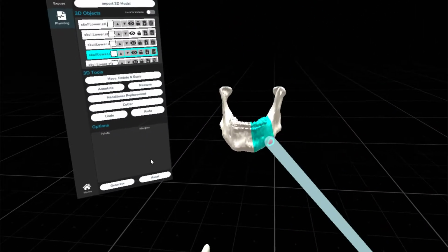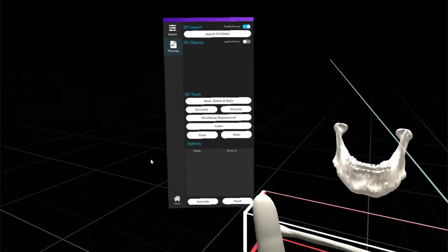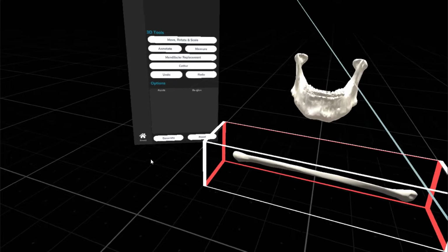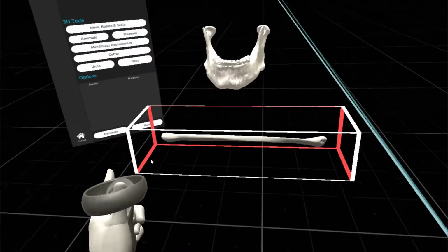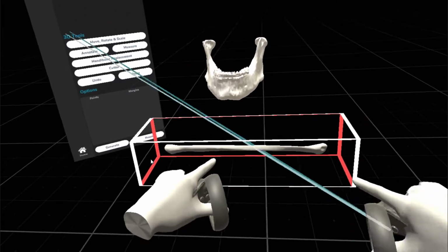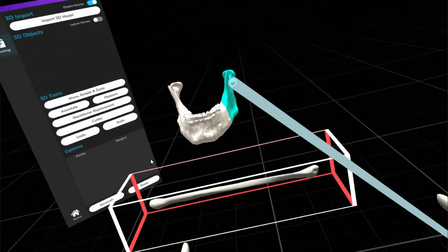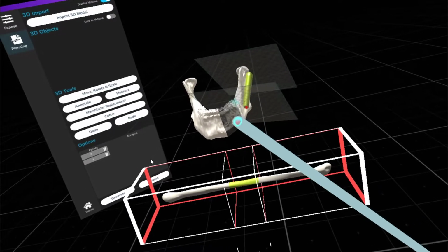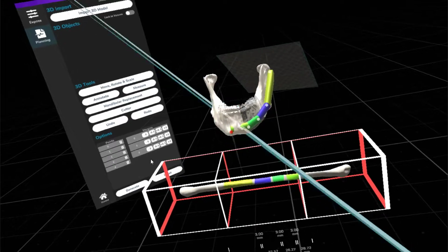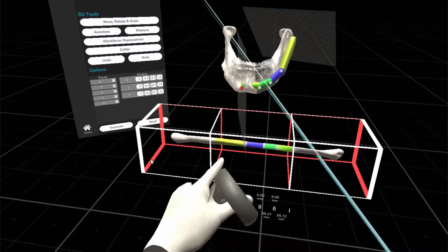The very first thing you want to do is select the bit of geometry that's going to be acting as the cut, or that's going to be replaced by the fibula. And you can see as soon as you select that bit of geometry, you'll get the preview of the fibula down below. So now we can go ahead and start selecting some points on our mesh. So we'll do 1, 2, 3, 4, 5. And obviously the representation of the point is all down below as well.